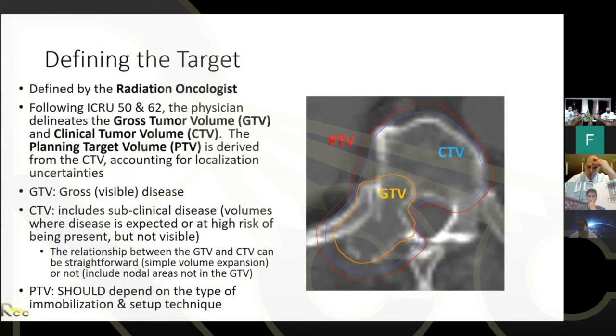And then there's subclinical disease that you see around that GTV. When you expand the volume to include that subclinical disease, you create a CTV, right? So the GTV is part of the CTV. The CTV is basically a tumor volume created to encompass what you cannot see. And then to include the uncertainty in the positioning and motion between fractions, you add an additional margin, and that's your PTV now. So it's not that you're looking at the density per se, right? Like your position.